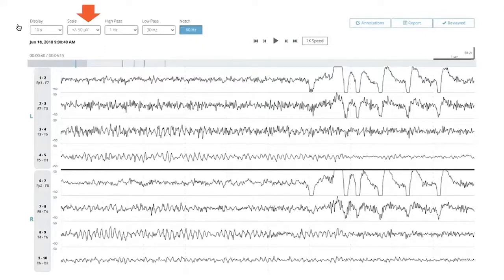Right. And some people have a thinner skull, and the amplitude recorded by electrodes will be higher to begin with. And that's fine. So amplitude, as Dr. Stern said, is not a big differentiating factor. What is important is the shape of the waveform.